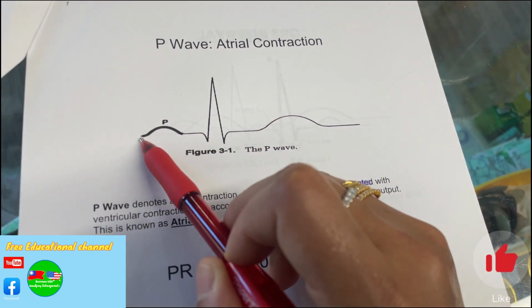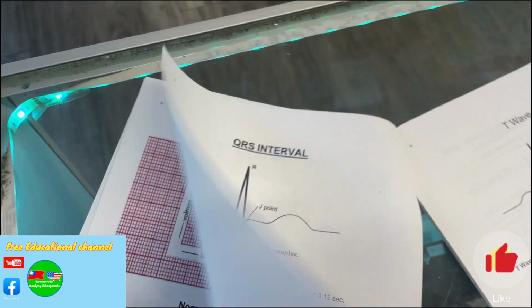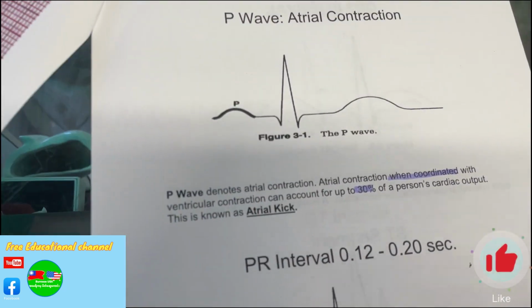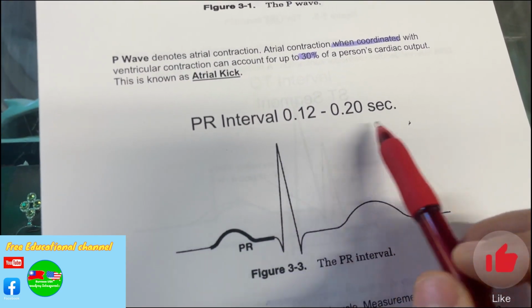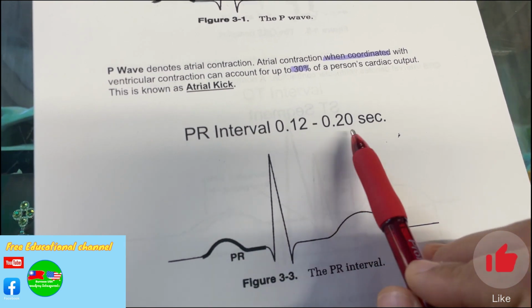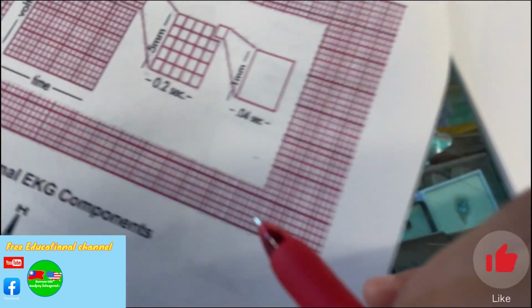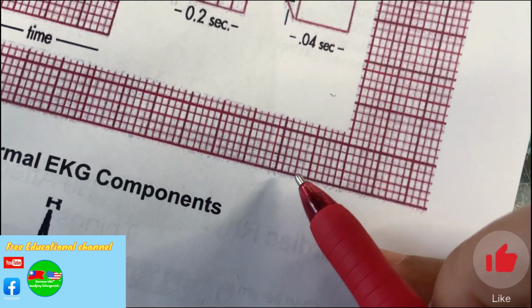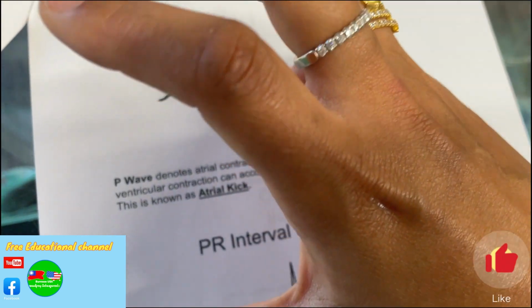So the Q right here, starting from the P to the Q. I'll show you the example in a minute. Okay, so right here, PR interval, okay? You have to remember this timing, okay? 0.12 to 0.2 seconds. That means 0.04 is one box, right? 3 to 5 boxes. 3 to 5 of these little boxes, okay? 1, 2, 3. It can be more. If it is more, that means your ventricular is actually pumping very slow, okay?